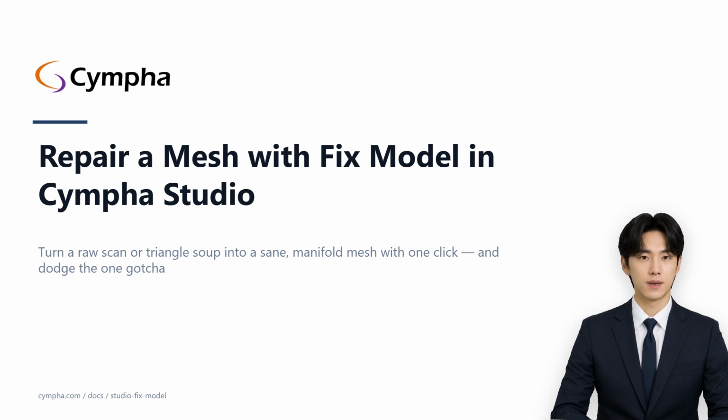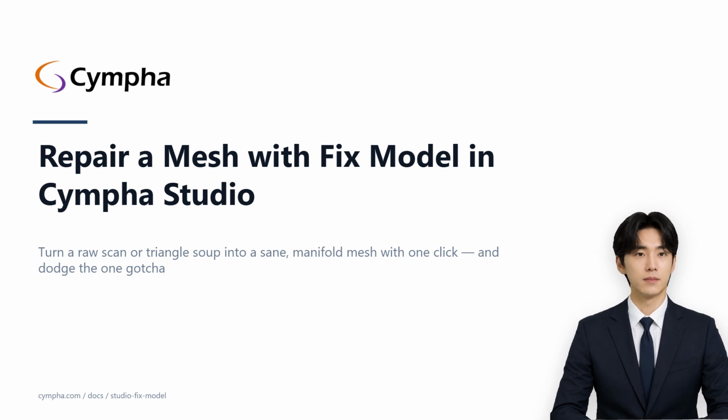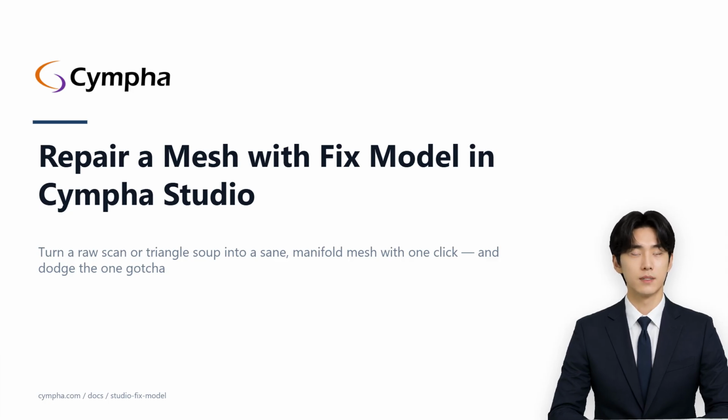On time, this is a seconds-long operation. The pipeline takes a moment on a single arch scan, and noticeably longer on a dense full-mouth mesh, but it is never a job you schedule, it's a click you make while the file is still fresh on screen. It's a short lecture too, so follow along in studio, or listen now and read the written guide later. Let's go.